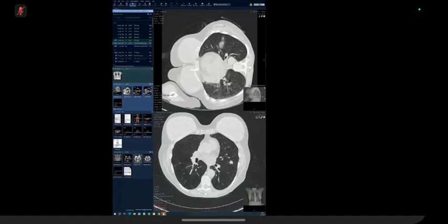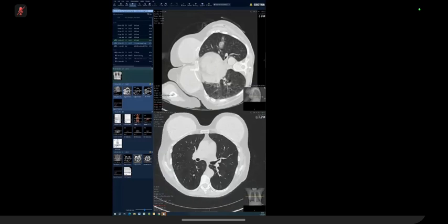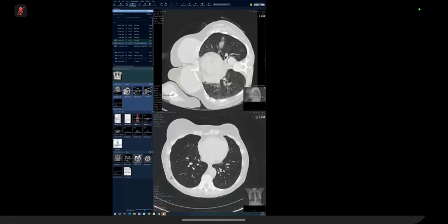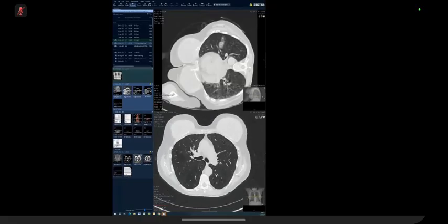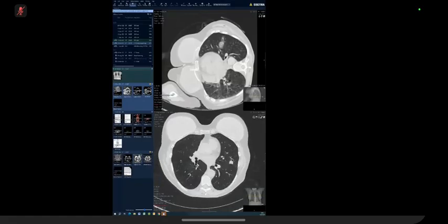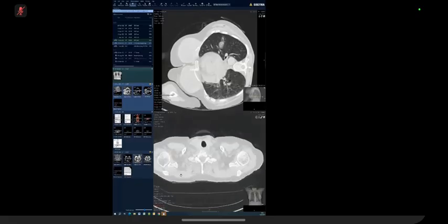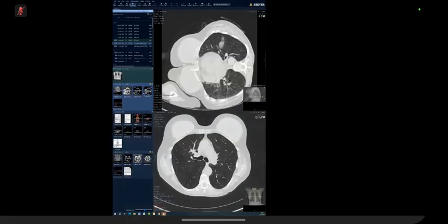If it wasn't a lung primary, your first thought was metastatic from extrathoracic malignancy because they're bilateral. If there's no known primary, you're suspecting a lung primary. Either they're both primaries or one of them is a primary and the other is the met, or he has something in the head, or it's a melanoma or something weird and wonderful. So, like I said, we'll come back to it at the end.